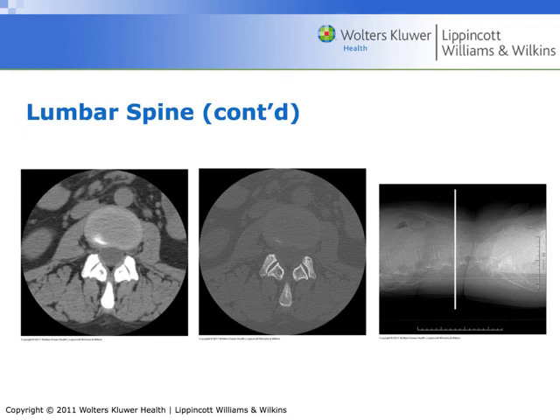Okay, last slide. Inferior vena cava, aorta. A little bit difficult to see here, but this is the annulus fibrosus. And then right in here you can see a slight change of density, and that is the actual intervertebral disc. So it's between L2 and L3. We can actually see we're at that level right here.